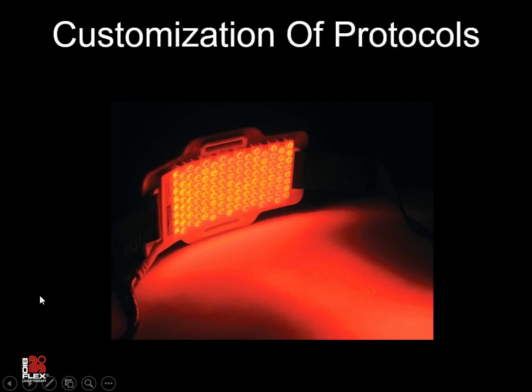Customization of protocols. In this webinar, I'm going to informally discuss how you go about changing protocols for different scenarios. So what I'd like to do is pull up the software and run you through the basic parameter changes and how you would go about changing frequency, duty cycle, and other parameters, giving you some basic case studies so that you can incorporate this with your patients.